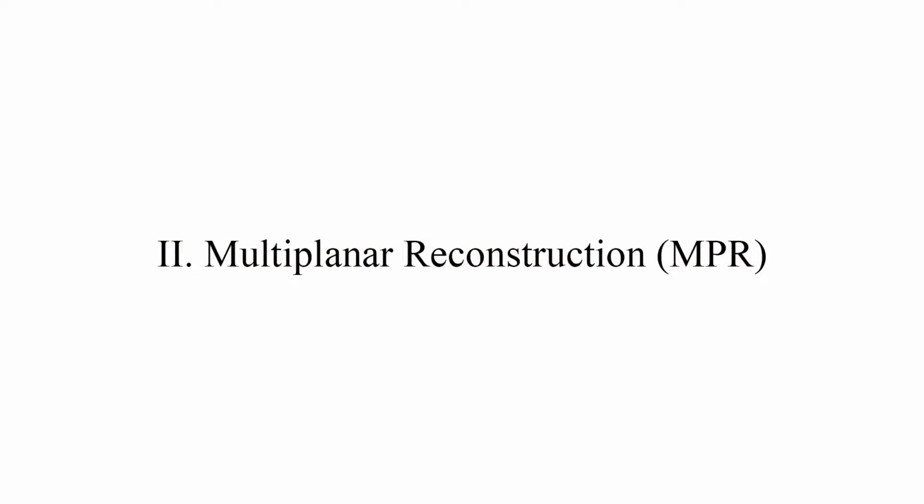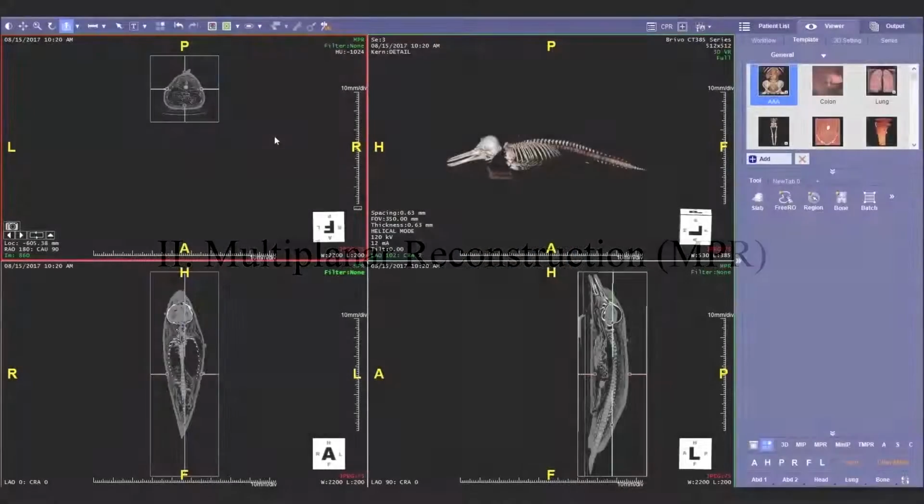rendering and review. Eight image rendering techniques, consisting of both 2D and 3D rendering, are routinely applied to each stranded cetacean for the biological health and profile investigation. The first one is multiplanar reconstruction, MPR.